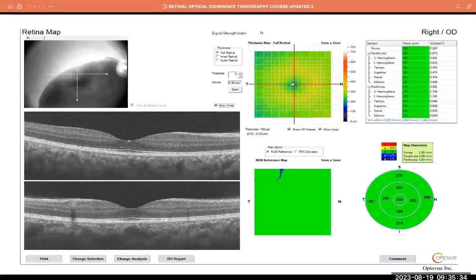I've removed the patient name and the biodata and date of capture because I had to crop this image, to protect the patient. The first thing you look out for here, apart from those biodata, is the signal strength. Signal strength in this is 74, so this is acceptable.